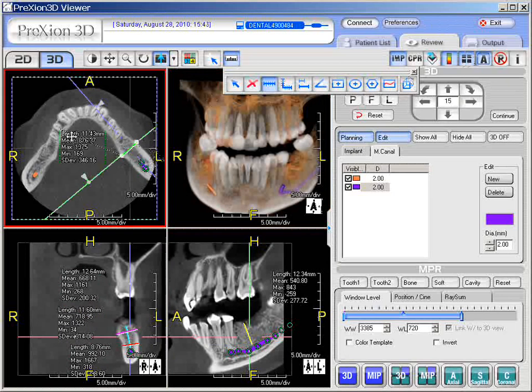So here we know that we can say, okay, maybe the occlusal diameter is going to be a little bit more than the apical diameter, so maybe we'll put a tapered implant in here, let's just say. All right. So here, if you've got 11, you subtract 2 from each side approximately. Okay, so you've got 9, you've got 7. Maybe you go to 5, about a 4 millimeter occlusal diameter.